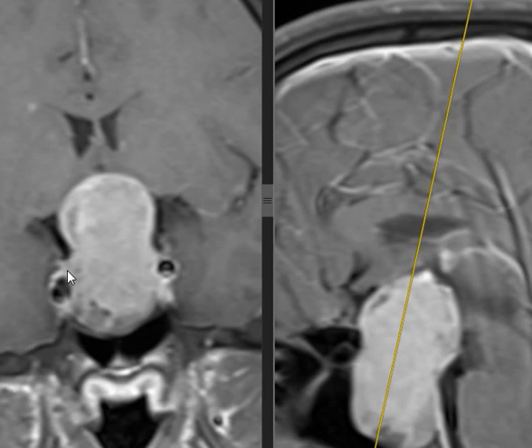Calcification. It's an MRI, we don't see calcification that clearly. What else? Craniopharyngioma is mostly suprasellar, but maybe it extends to or from the intrasellar region; this is not against. It has a suprasellar component. What's the content of craniopharyngioma? Cystic and solid. This one has no cystic component. And the cystic component contains what? Proteinaceous material, like machine oil. It's bright on T1, which we don't have here. So this is unlikely to be craniopharyngioma.